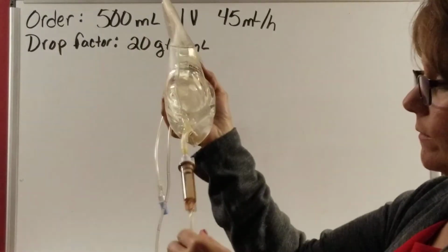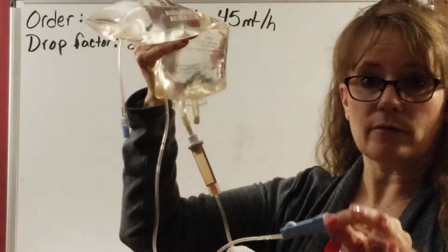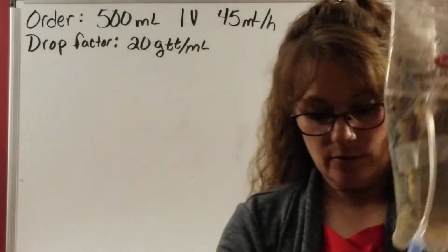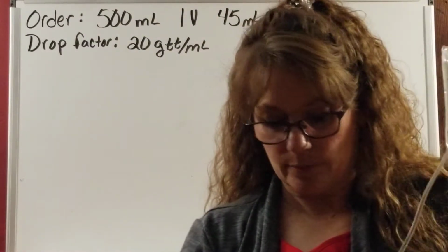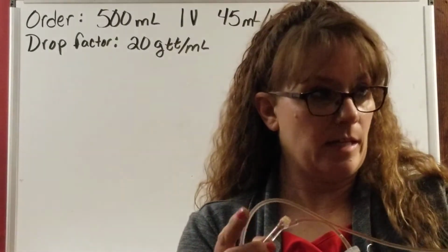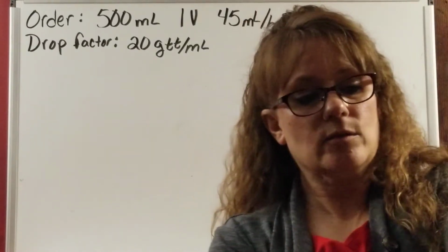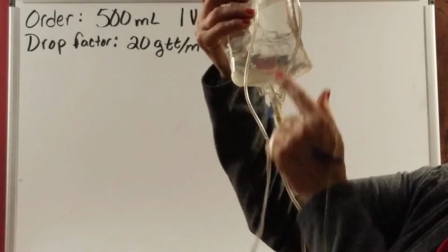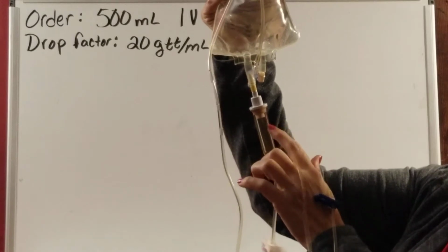This here, though, this is what's connected into it. All this here is called the drop factor. And it connects into the patient's IV. We have PICC lines where if they have to come in and give you medication, painkillers, or antibiotics, or whatever it may be, they put it in through the PICC line. This right here is where it shows the actual drops from here. I got it closed off so it don't go everywhere. But once you get it set, you'll see the drops drop through here.